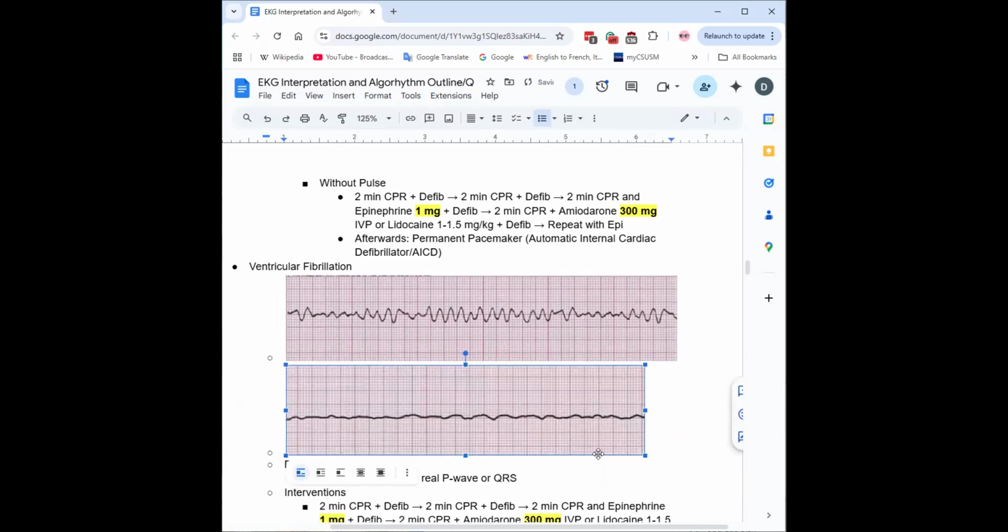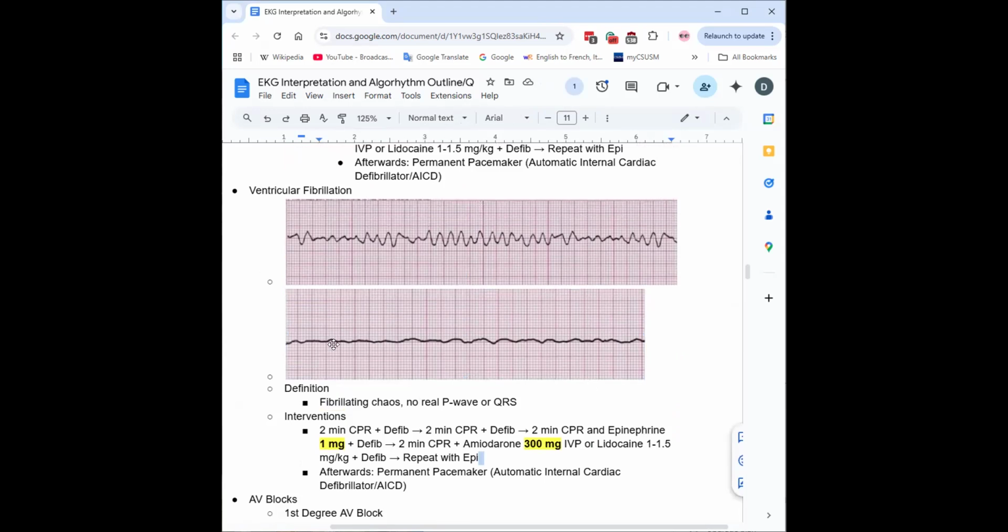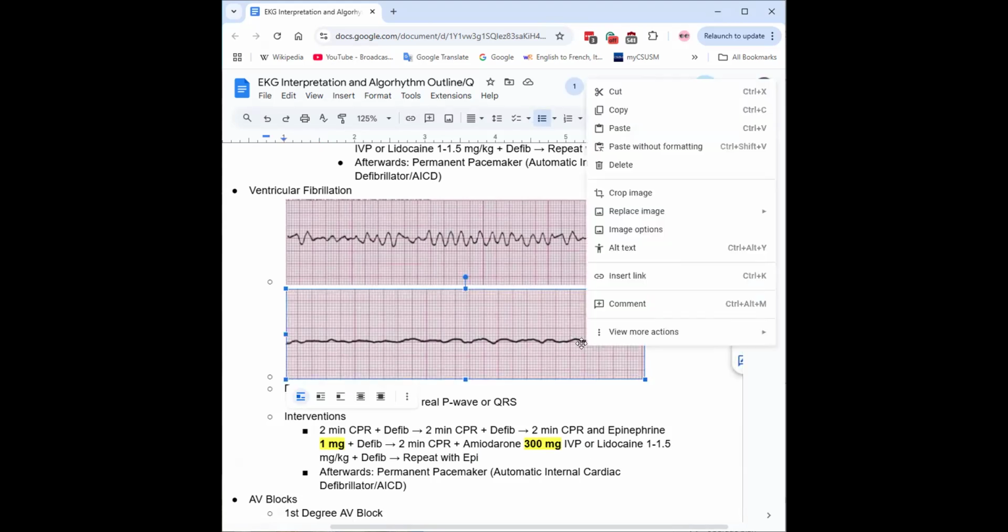With this one, you could make the argument that this is asystole. It's very close, because it's not always fully flatline for asystole. Very close to it. Just keep in mind that asystole might look slightly like this. It doesn't have to be fully flatline, so you can confuse the fine VFib and the asystole. But for the most part, it should be pretty obvious on the test.